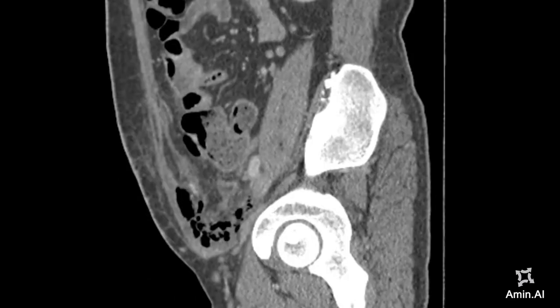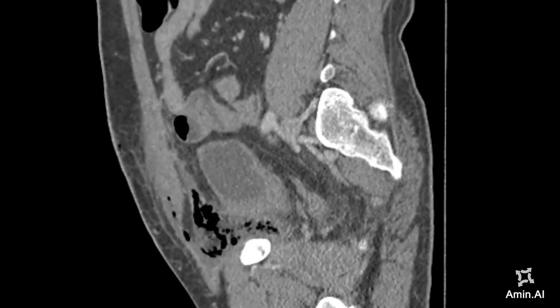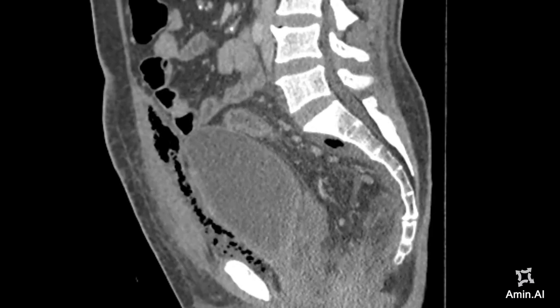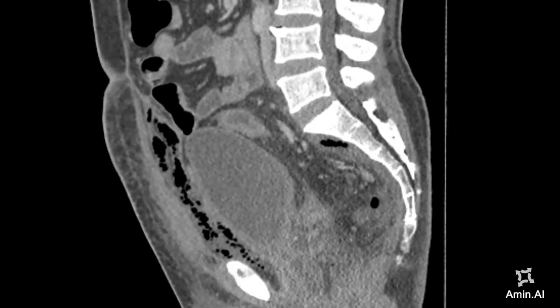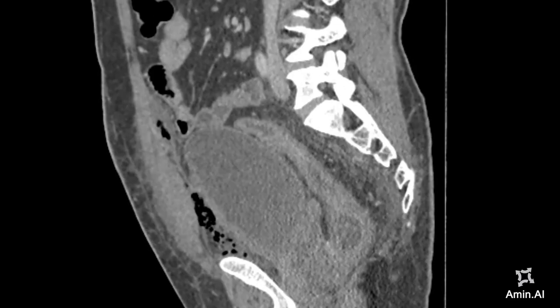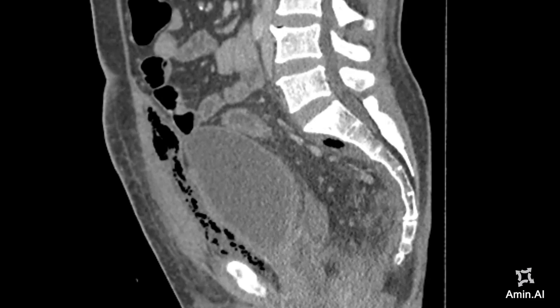And so this patient of retroperitoneal necrotizing fasciitis is a surgical and medical emergency, and identifying the pathology early and reporting could help you save a life, because otherwise it has very lethal consequences.